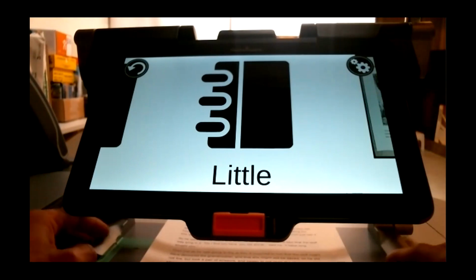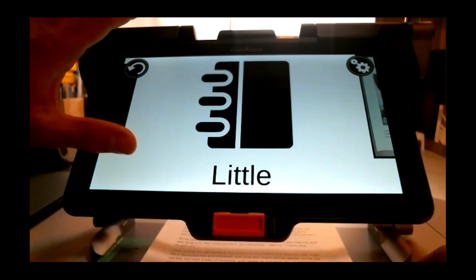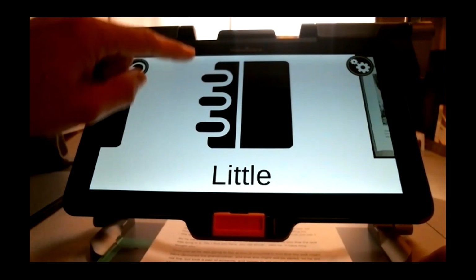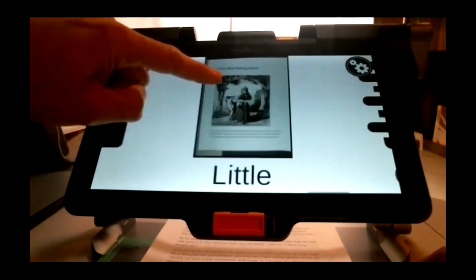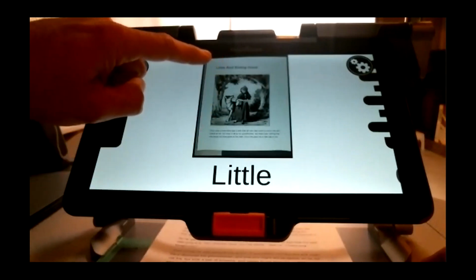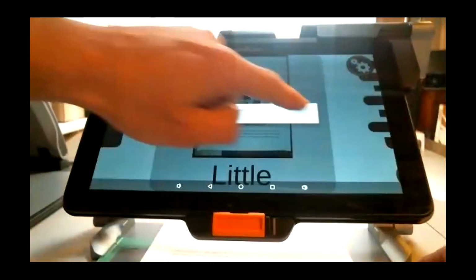Now, in the gallery, when I want to move, rename, or even share my work or a document with somebody else, let's say, for example, a teacher, what you do is on any kind of document in my gallery. So it could be this book binder here. It can be my single capture here. You can do a press and hold on that.